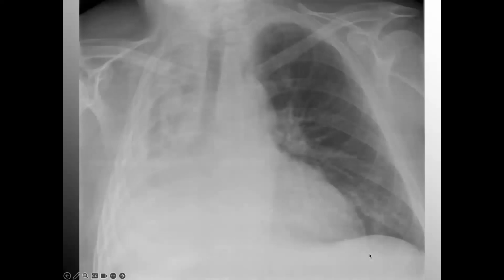So starting again back with your original technique, take your time. I'm going to stop talking for just a moment. See if you can interpret this x-ray using the ABCDE method. Airway and adenopathy, bones, C for cardiac, D diaphragm, E everything else. I'll give you one moment. Stay with your system. The first thing you're going to see is the airway itself is offset.